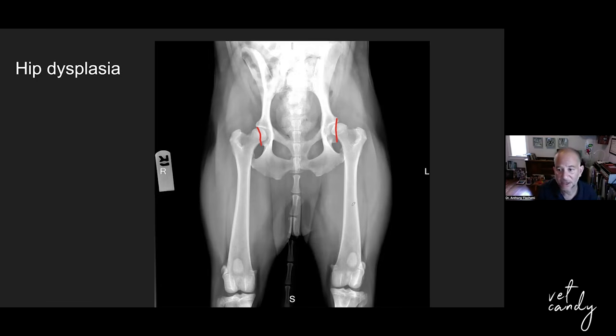There are different screening tests we do for hip dysplasia. This view is what's done for OFA screening. You have to wait until about 2 years of age to get a full certification from OFA. There are issues with the hip extended view. It makes the hips actually artificially look better. By torquing on that joint capsule, it makes the hips come in better.